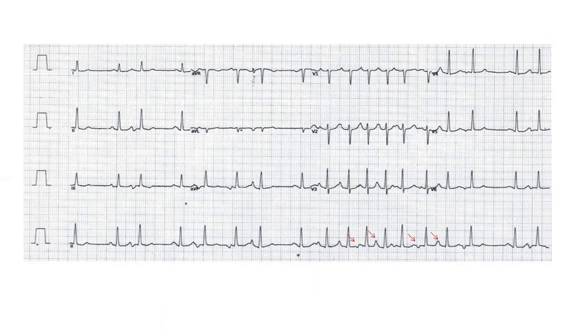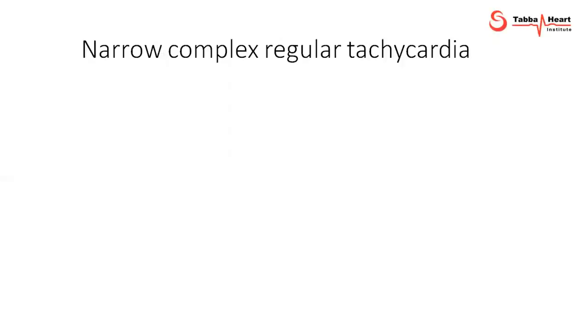We usually don't see MAT in cardiology practice a lot. We usually see this more in ICU settings. Now, switching gears from irregular narrow complex tachycardia to narrow complex regular tachycardia.